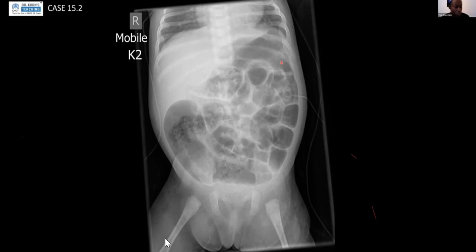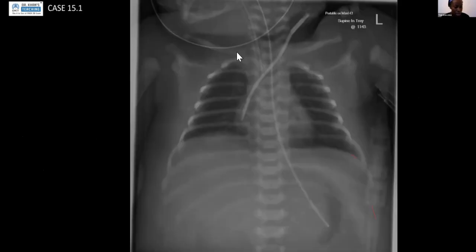And then you can do a lateral shoot through. So either turn the patient decubitus and image them that way, or shoot through the side of their abdomen and you look to see air at the upper part of the abdomen, like Sam showed in one of her earlier cases. I'm just going to go back to this. If you follow my pointer, this lucency in the abdomen is abnormal. So this is the pneumoperitoneum.